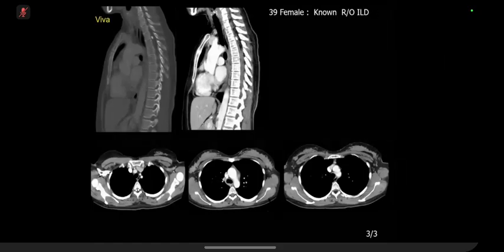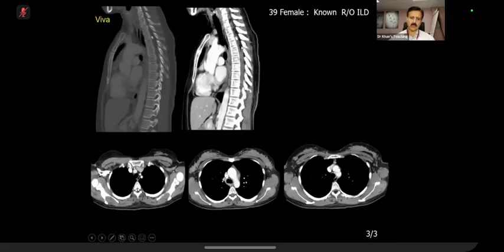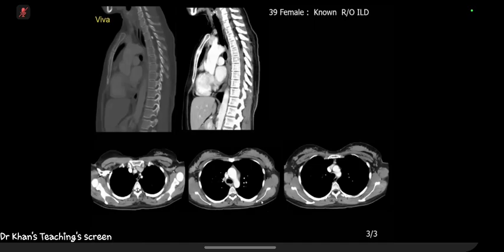If they had, this is a contrast enhanced, isn't it? So I would look at the pre-contrast, if there was one available, to compare just on CT alone. Ideally, it would be great to evaluate on MR, but can you see this density and compare with this subcutaneous density? Overall, it's quite a low, heterogeneous looking cord lesion with potentially calcification and fat density.